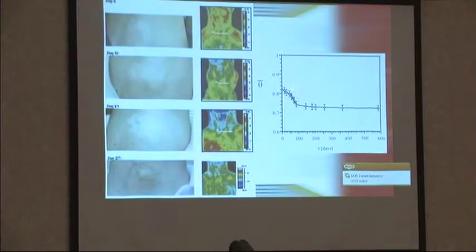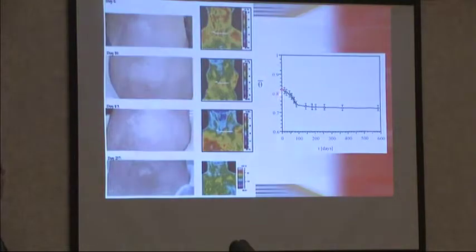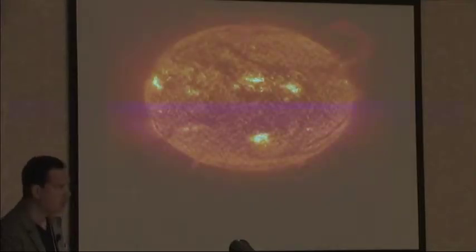But if you see the visual image, there's no difference until 300 days. By dimensional infrared image, it was possible to see that he had a response to the treatment on the 80th day. What treatment did you roll out?